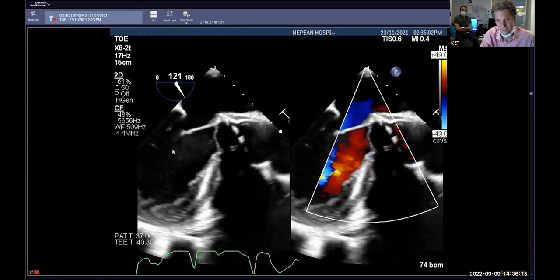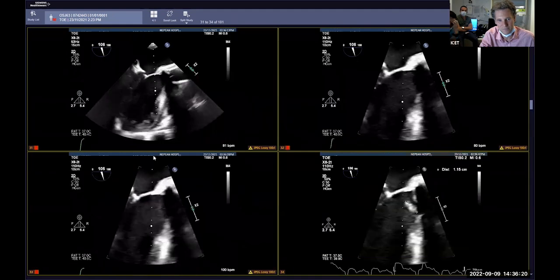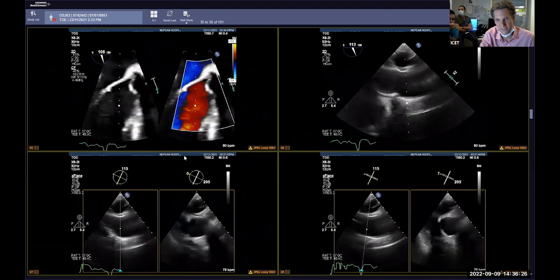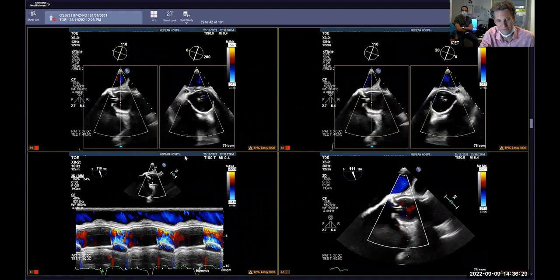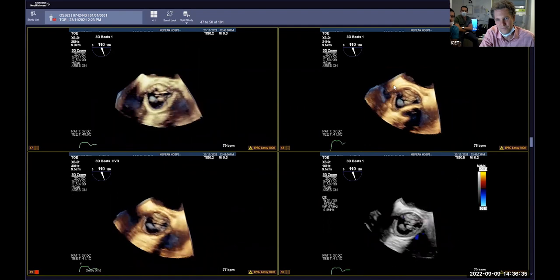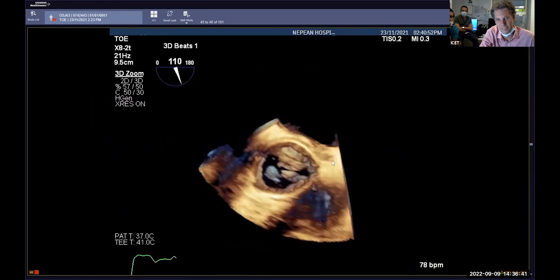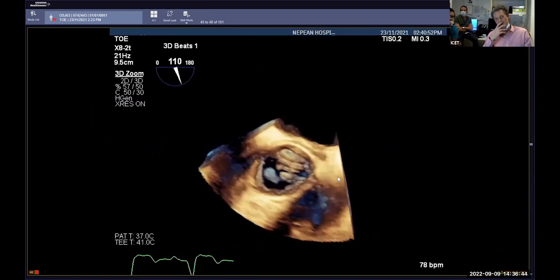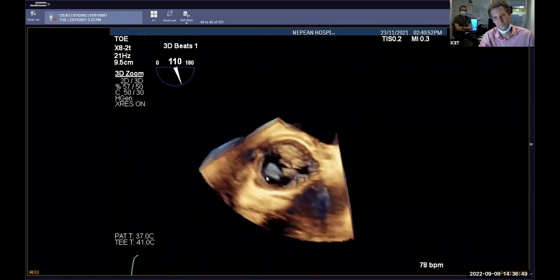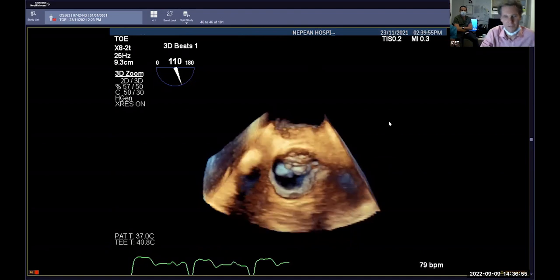Beautiful, isn't it? Oh, not for the patient, excuse me. Bloody awful. So if we've got actually 3D, that view you can see it quite nicely. The structure. No, this is Faraz who did this. See what he can find on this 3D. I don't think so. No, I think that's all right, let's move on to another case.